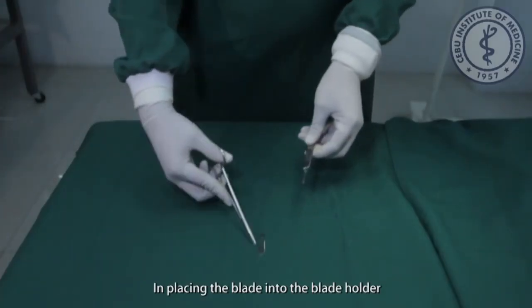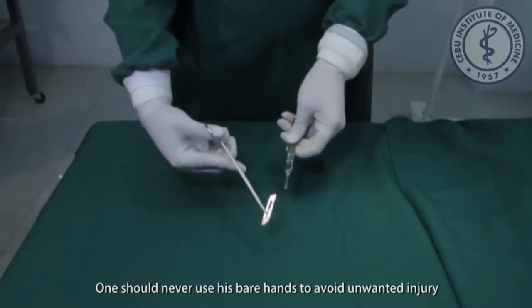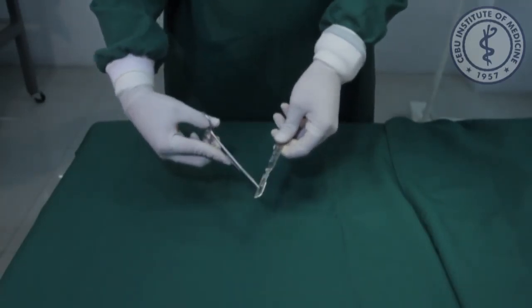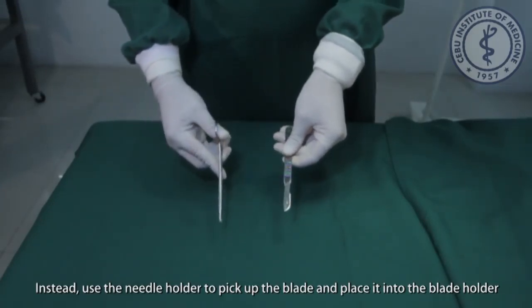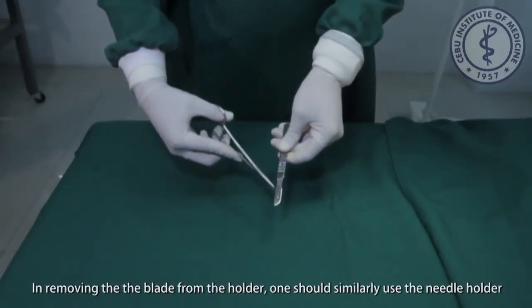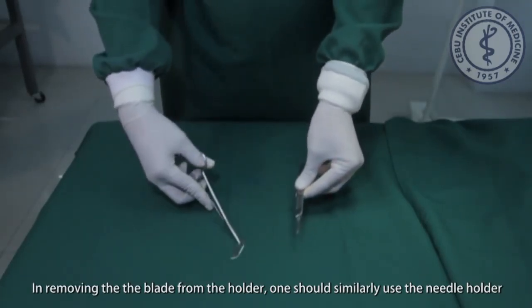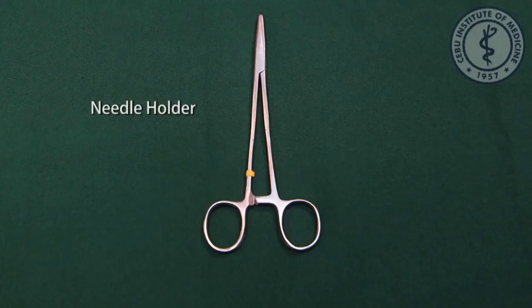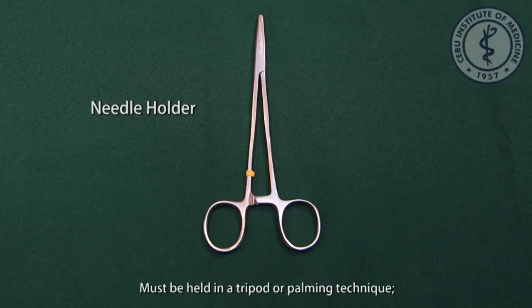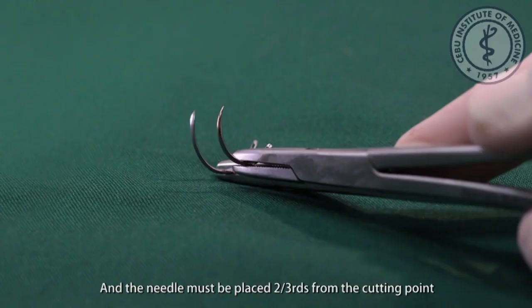In placing the blade into the blade holder, one should never use his bare hands, to avoid unwanted injury. Instead, use the needle holder to pick up the blade and place it into the blade holder. In removing the blade from the holder, one should similarly use the needle holder. The needle holder must be held in a tripod or palming technique, and the needle must be placed two-thirds from the cutting point.